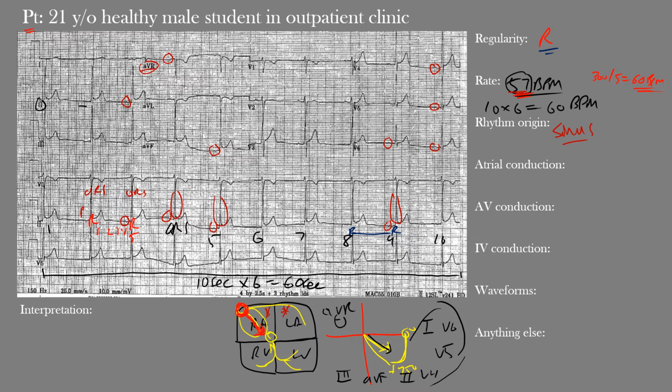Well, typically we look at lead 2 and lead V1, which sits right here, because it pretty much gives us a short axis view of both the right and left atrium. So it's good for seeing if there are any atrial abnormalities. As we said, it's a little hard to make out those P waves here, but they're certainly not prolonged or abnormally enlarged. Remember, the normal P wave duration is less than 120 milliseconds, so that's 3 small boxes. So we have normal atrial conduction.